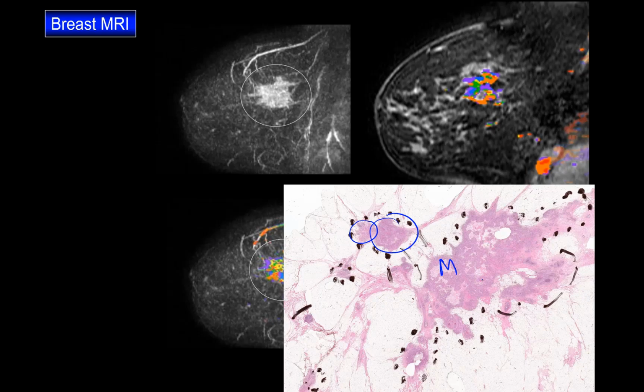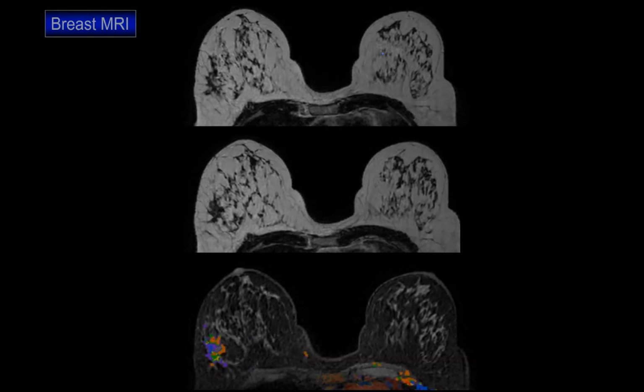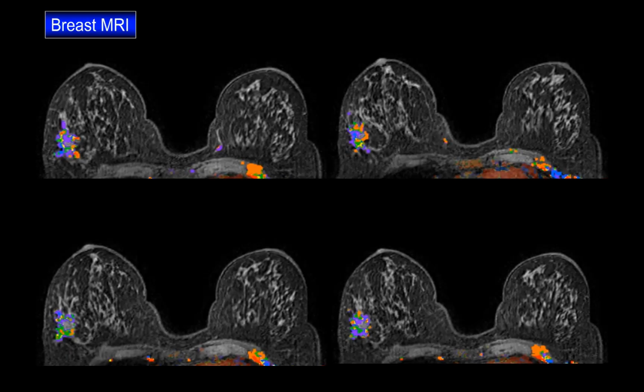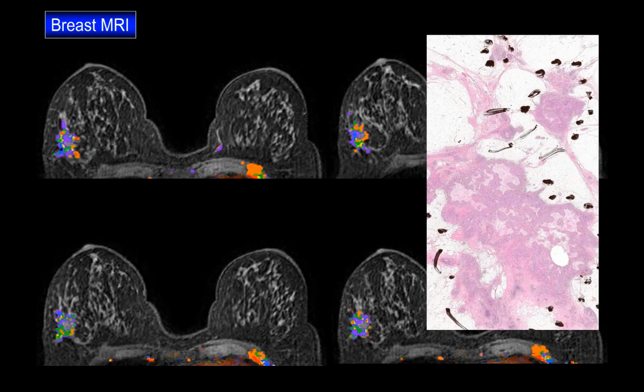Multifocal is bad enough, plus diffuse. Now that's double trouble. This is not a nice cancer. But that's exactly what is so characteristic for pattern 4. Look at the extent of the disease. It's a very extensive disease, multifocal and diffuse.